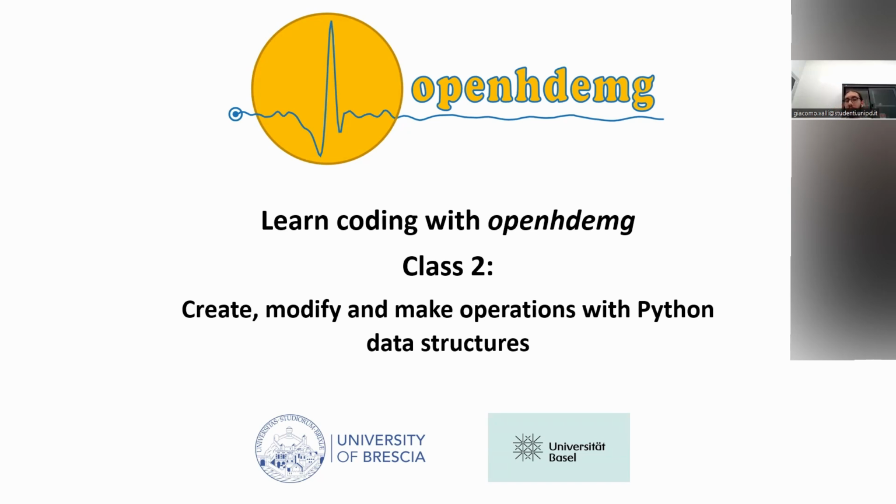Today, we take a step further, so we move to a more, let's say, hands-on approach, and we will look in particular at how to create and how to modify these data structures that we already saw, and most important, how to make operations with them. So we will not just look at them, how they are, what they can do, but we will really do things with them.